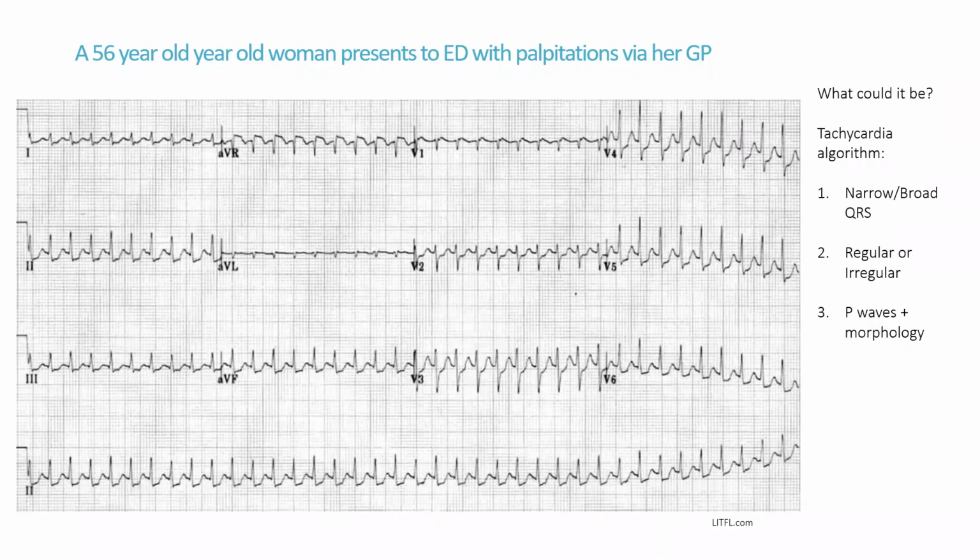Are there P waves? Well, I've already kind of answered that one. The honest answer is it's hard to tell. What are these things here? It's going so fast we can't tell if that's a P or a T wave. You don't know is the short answer. So we can't really obviously see them at the moment, and we can't really work out our P to QRS.